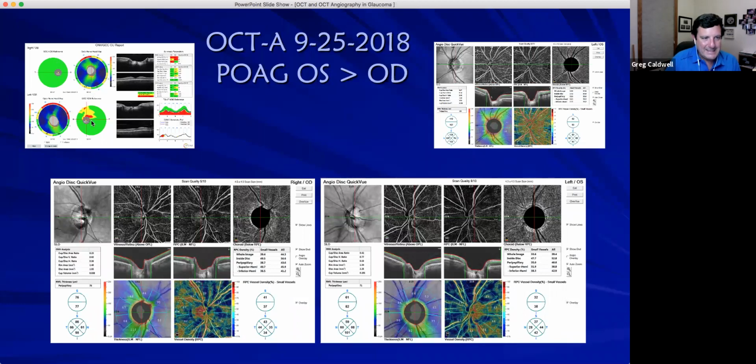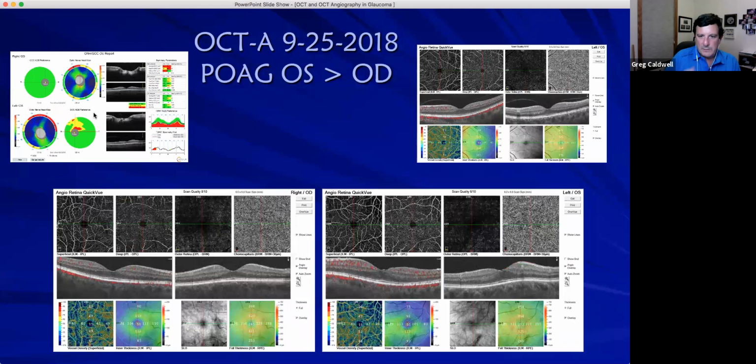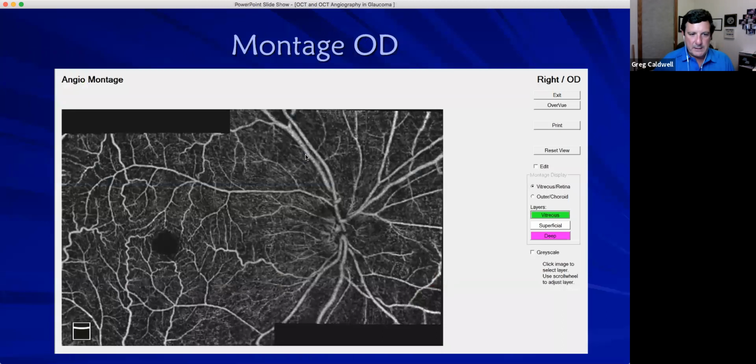And remember the macula scan, which is clean in his right eye, and thin superiorly in the left eye. So when we jump over to his scan, you can see what's happening in this left eye. You can see it's a little thin here. You can see he's thinning out, not so bad inferior, definitely superior. And you can see what's happening over here in the right eye, maybe a little thinner than we would expect, but remember it's flagging it here as being green. So it's nice, again, being able to use all the tools within the toolbox when treating glaucoma.